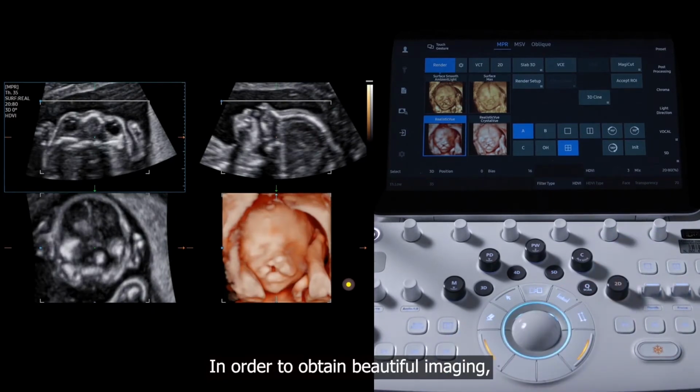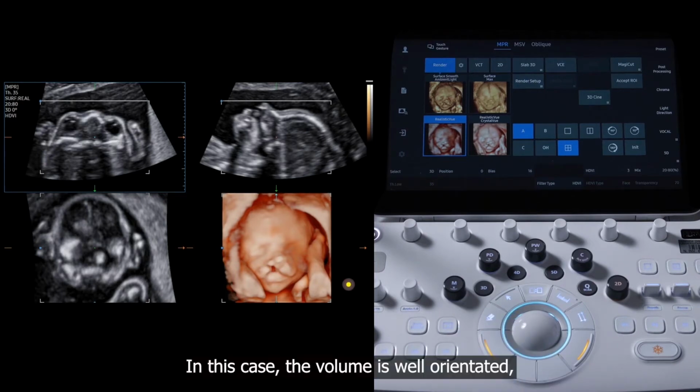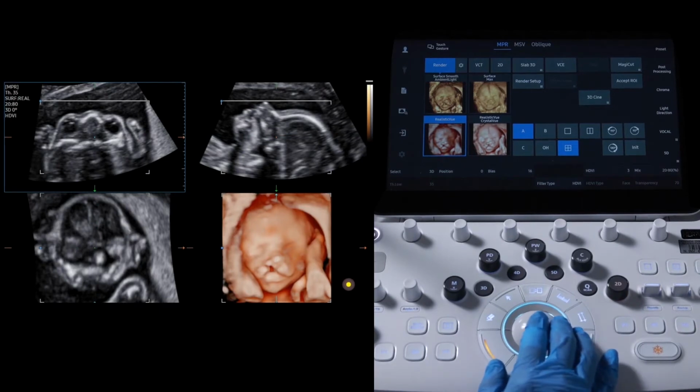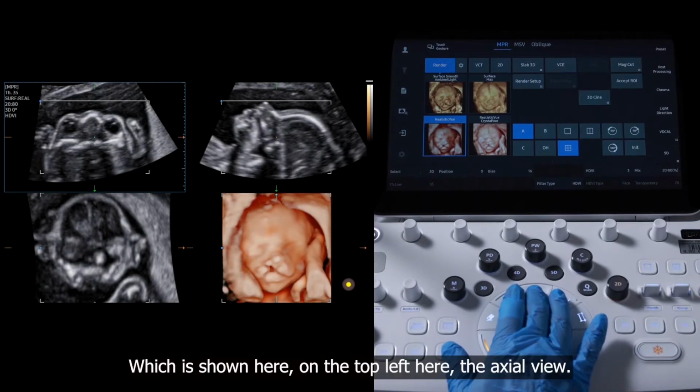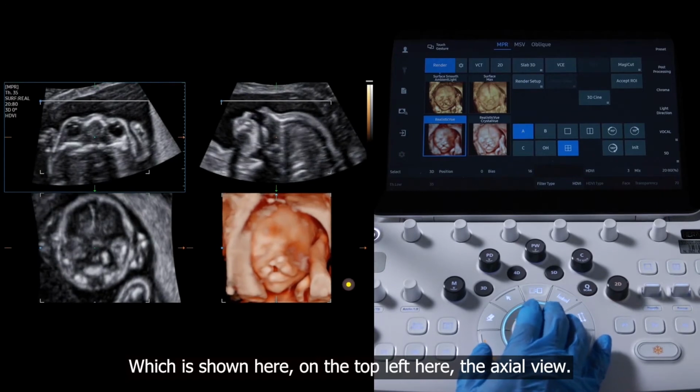In order to obtain beautiful imaging, you need to obtain a good volume and orientate your volume so that you know in every moment of your offline post-processing where you are in the volume. In this case, the volume is well orientated. I just need to tilt slightly on the Z-plane on the axial view, as you can see, which is shown here on the top left here, the axial view.